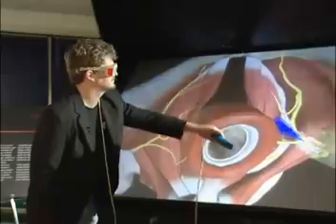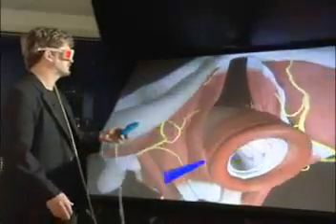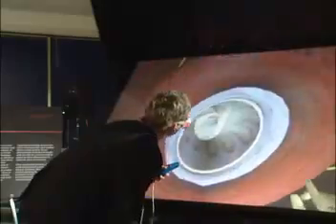Okay. Now let's actually take a little trip inside the rectum. Okay. And so we're going to actually lean in and get an endoscopic view. If we look up, we now see there's a polyp in there. Let's take a little closer view.